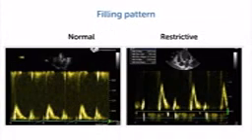But we have another way of looking at it if we actually measure the so-called deceleration time. What is the deceleration time? To understand, I need to go back to this slide once again, and we need to look at the curve. In patients who have very high filling pressures, we would have a very steep curve. Here, the descending part of this E wave would be very steep. Compare this to this, right? And so the shorter this deceleration time is, the higher the filling pressures are.